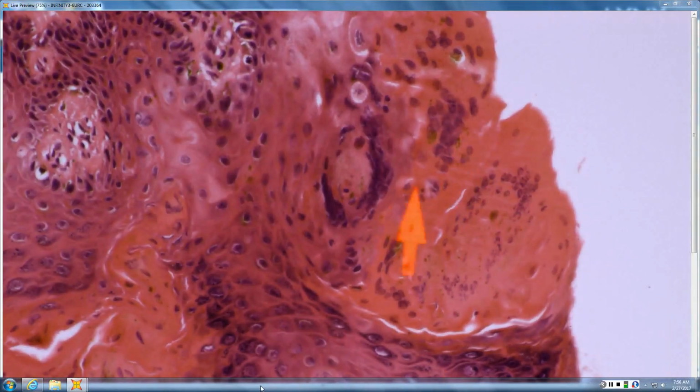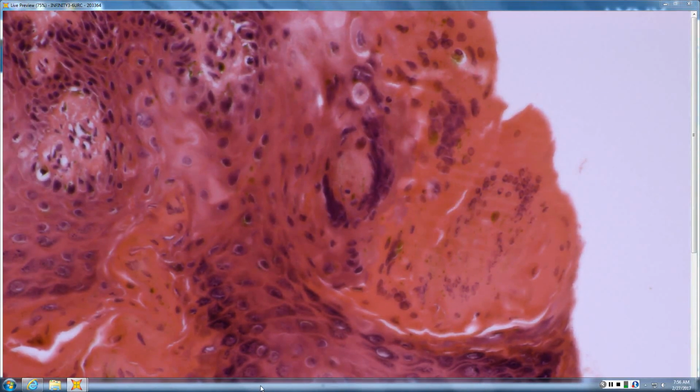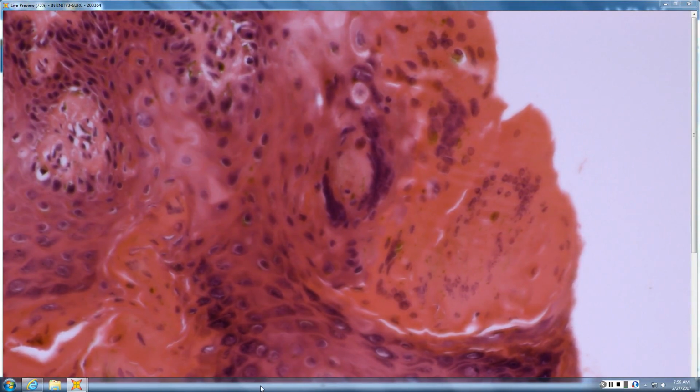You see the viral cytopathic change, the peripheral basophilic chromatin. It's important because you still see these patients. No one knows they have HIV. They haven't been tested. They show up with these verrucous cutaneous lesions, and the biopsy tells you not only herpetic, but that the person is HIV positive. So, very important diagnosis to make.